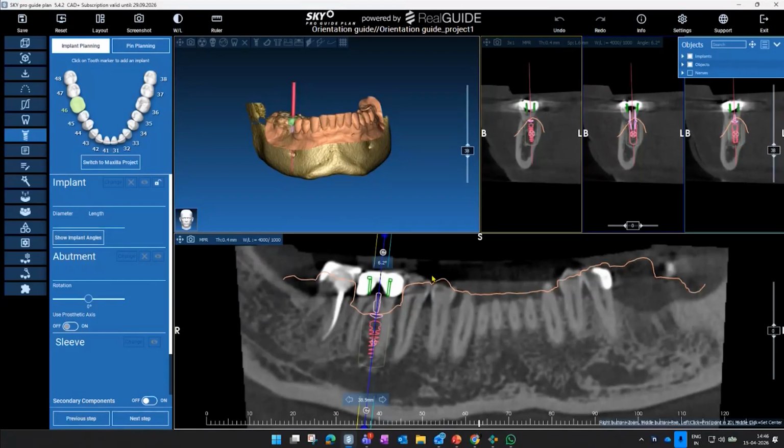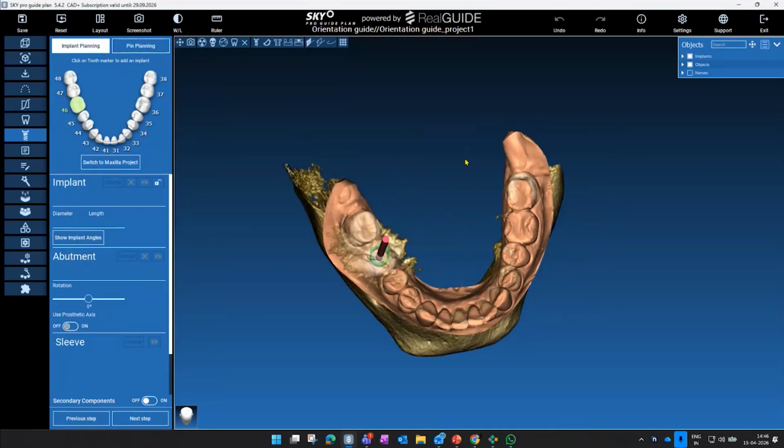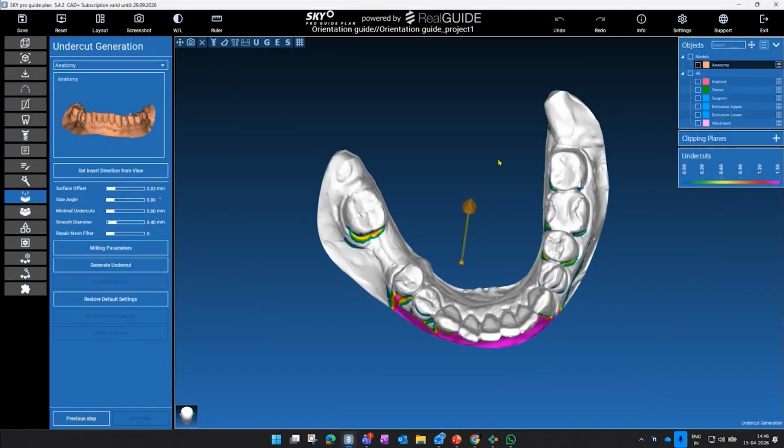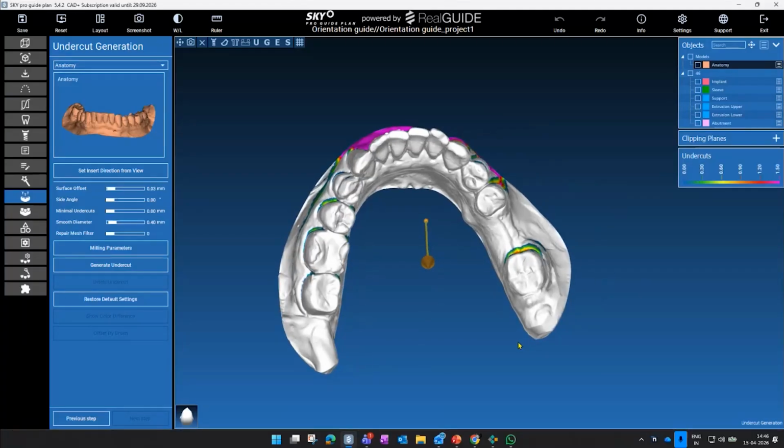All these guides we have spoken about are for those who have the SkyPro Guide surgical kit, those who want to do guided surgery with all the desktop and everything. But in some situations, if you don't have any Pro Guide kit, you are freehand placing, but in some situations you want to use a guide. You will not be able to use exactly a sleeve, but at least it will orient you to the angle. So this is why I'm talking about this orientation guide.